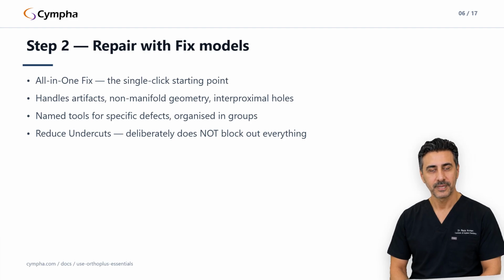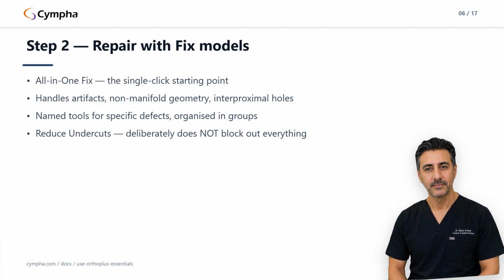One last piece of guidance on this page. Spend more time here only if the mesh has obvious artifacts. This isn't a step to perfect for its own sake. It's a step to get past. But don't skip it either, because a clean mesh makes every later step better.